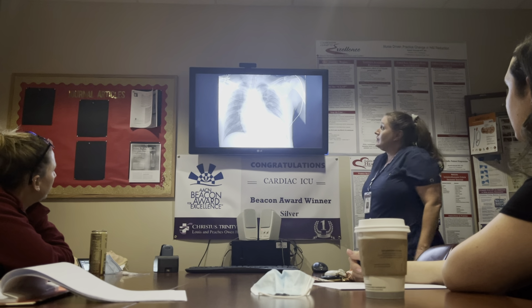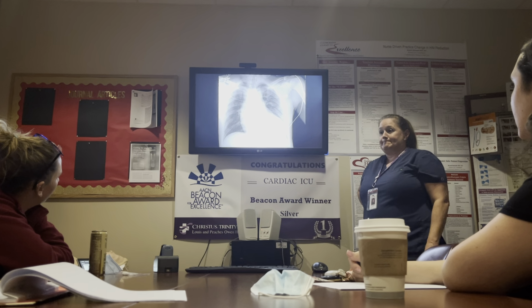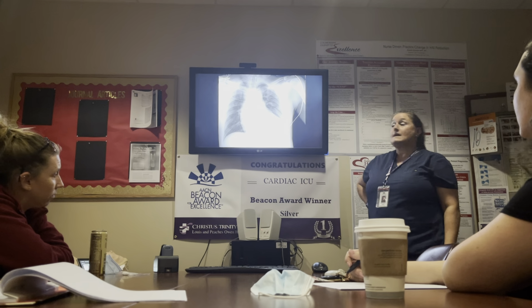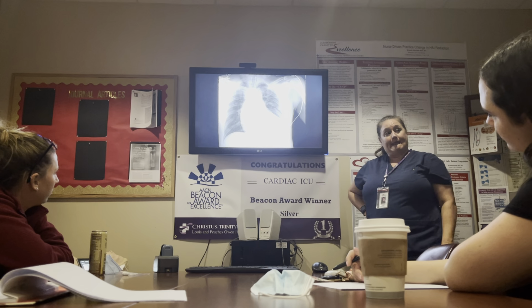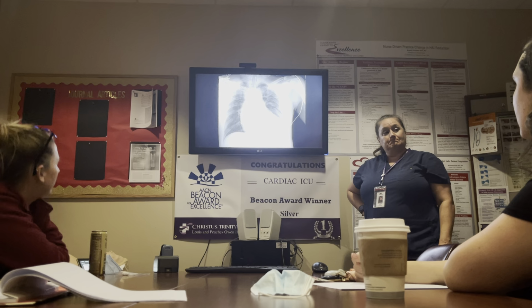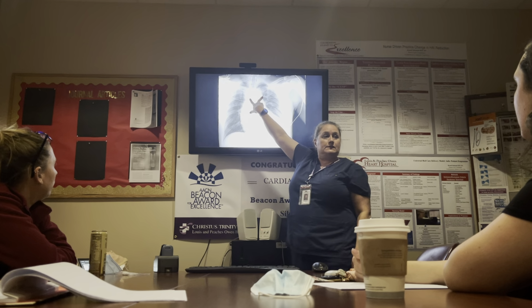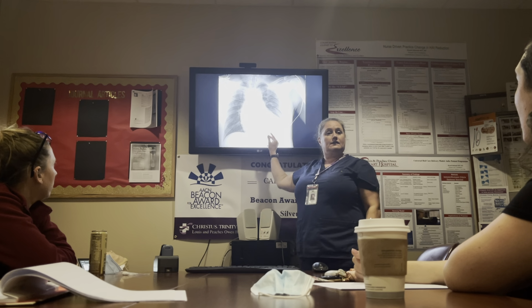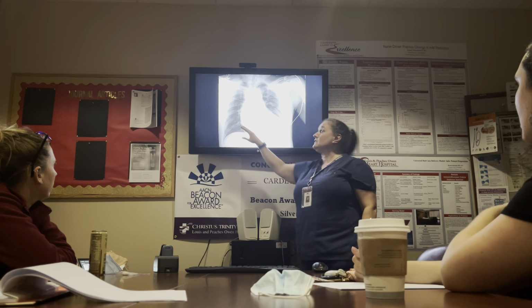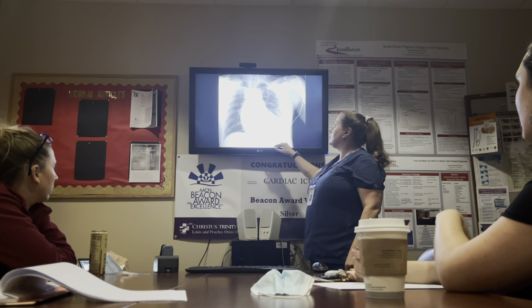All right. We're almost done, guys. What is this? Is that an enlarged heart? It is an enlarged heart, but why is it enlarged? Why does it have an effusion? Tamponade, or what is... Mediastinum's wide. So this is an aortic dissection. It dissected down into the pericardial space. So the cardiac silhouette looks funky, but it looks funky because they've got a pericardial effusion. Okay.